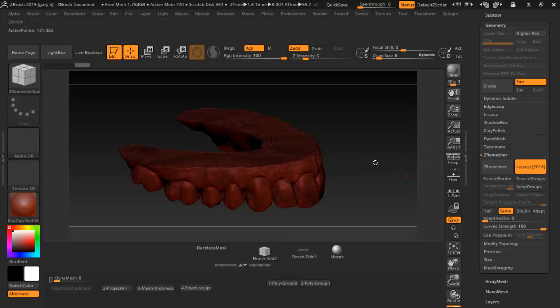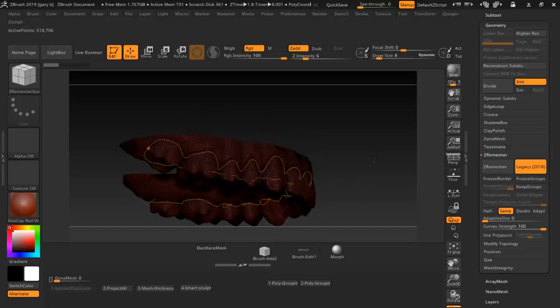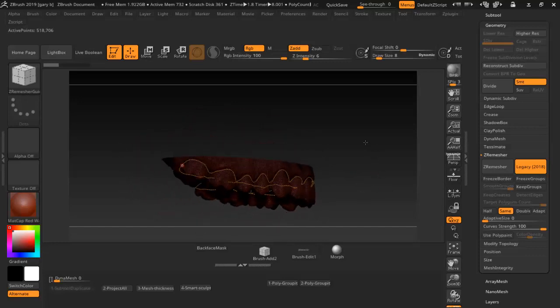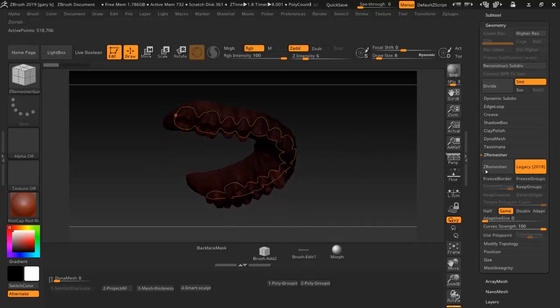We'll go back here again till we can see the lines. A lot of times, like I said, this will work, and it's usually because you need to move this to a different angle. I don't know why this happens. Sometimes just by moving this, and we'll try the Alt click here and wait a couple seconds. Alright, we got a winner on there.